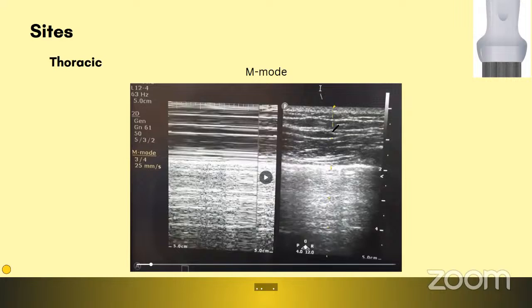So it's forming a cross section line. My line is quite haphazard because I'm using my mouse for it. My apologies. So this is the cross section activated on the M mode.